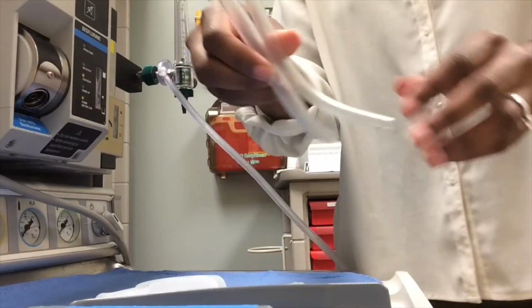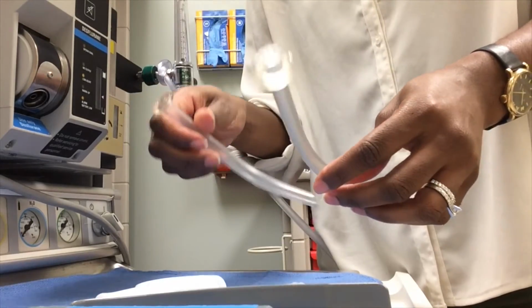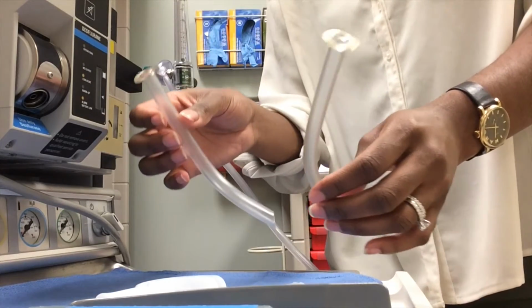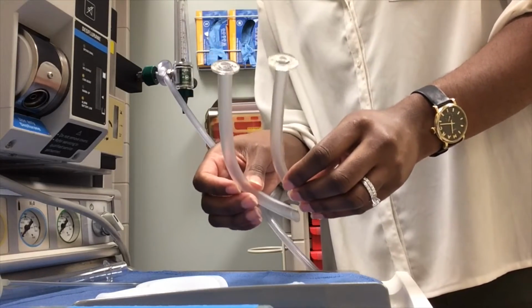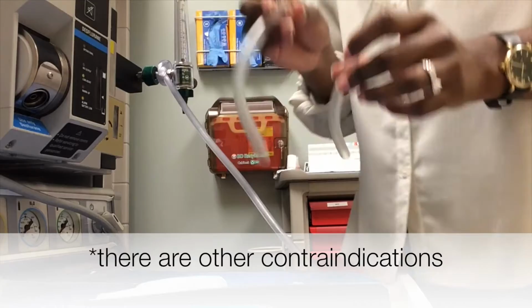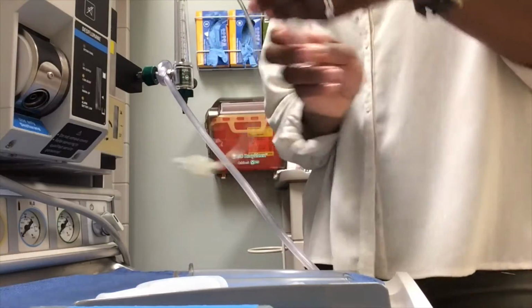I also have here the nasopharyngeal airways. And you can guess it goes through the nose. And they also have different sizes. Some of them have a color, some aren't see-through. It's just another pathway to get to the airway. An NP, nasopharyngeal airway, is tolerated better by patients that are awake. A contraindication to using this is if your patient has a bleeding or clotting issue, because that area is very highly vascularized.